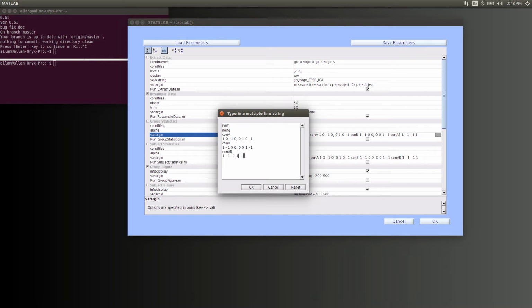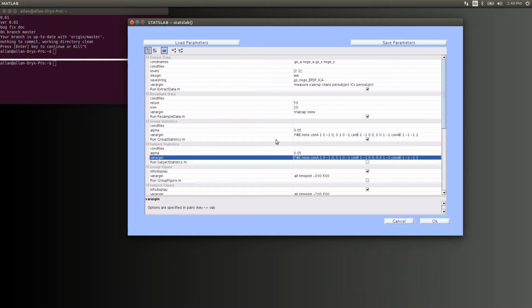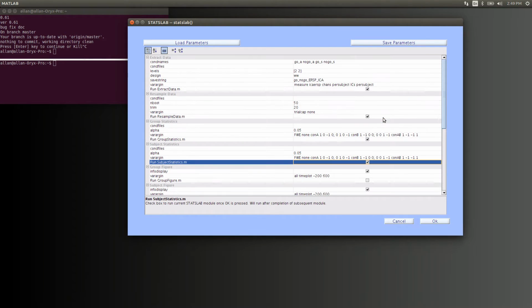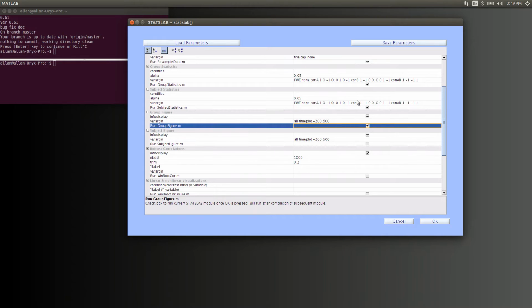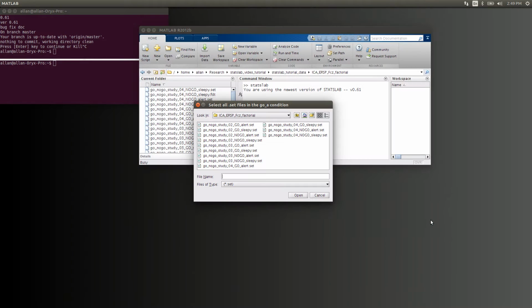That basically amounts to the difference of the differences, and I'll let you research contrast coefficients if you want to learn more about that. So that's how that works. Everything's good with that. And the same exact setup for single subject statistics, and we can run that. And let's just go group figure, and we'll just run the group figure for now. Okay, and let's go for it. I think everything looks good.